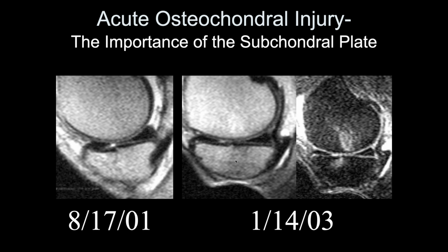And then over here on the follow-up, what we see is that that bone injury is healed with a little bit of irregularity, but now we've got a lot of subchondral bone edema on both sides. And this patient went to surgery, and there were full thickness cartilage defects at surgery, though we don't quite have the right spatial resolution on these low field scanners. I guess so. I was just suspicious there that there is a cartilage defect. I guess I'm over conscious. I don't know. In these images, I don't think we can resolve the cartilage adequately to know whether it's torn or not here on this particular sequence.